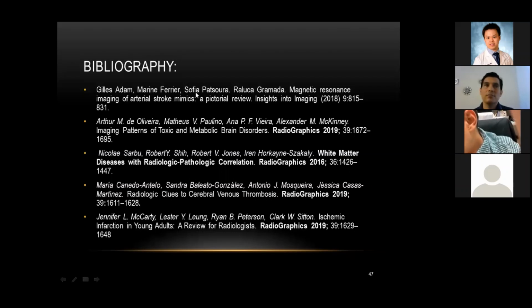This doesn't happen in the case of normal previous tissue, like in a stroke, for example, where the patient was previously normal, and you can see that in B0. In Covenant, you have the option to see the B0 and B1000.